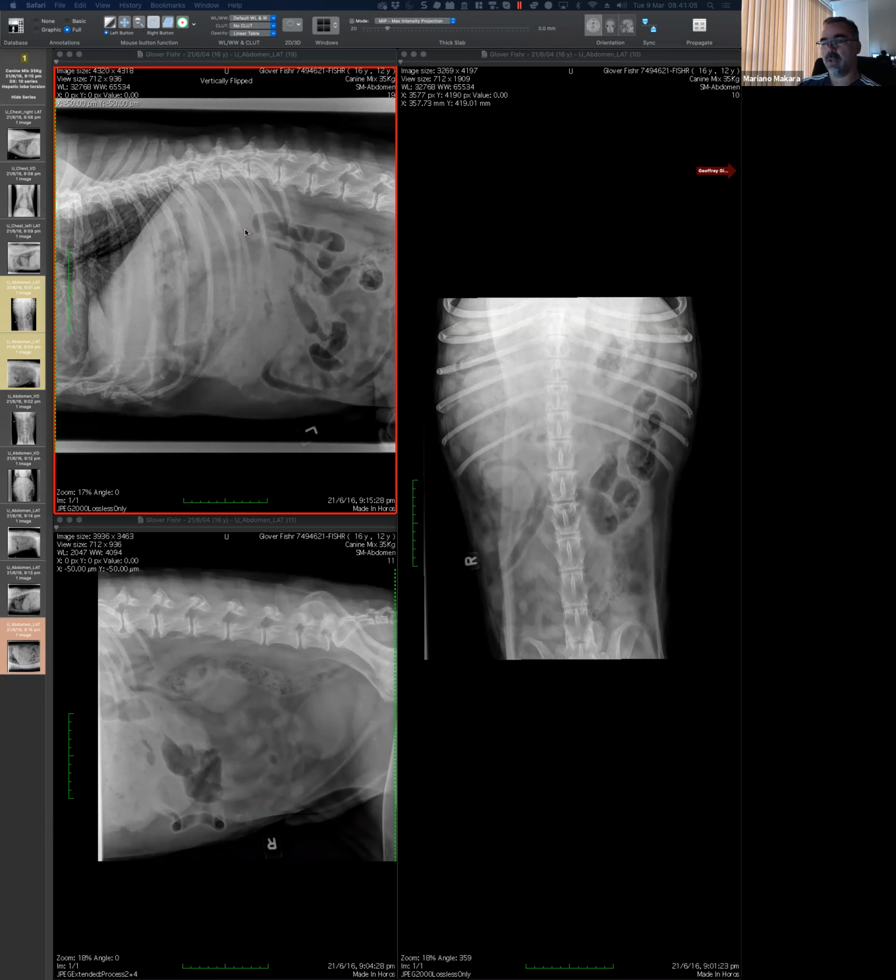Makes sense? But the exercise of trying to bring as many differentials as we can think about, I think is a good exercise. And I agree with you, along the lines of neoplasia, torsion, infection, like an abscess, granuloma. Okay. The abdominal pain is not consistent with my hemangiosarcoma theory, so probably have to discount that. Well, I don't know. I agree with you, but probably I would say maybe it's an unusual presentation. Maybe there's a torsion on top. I don't know.